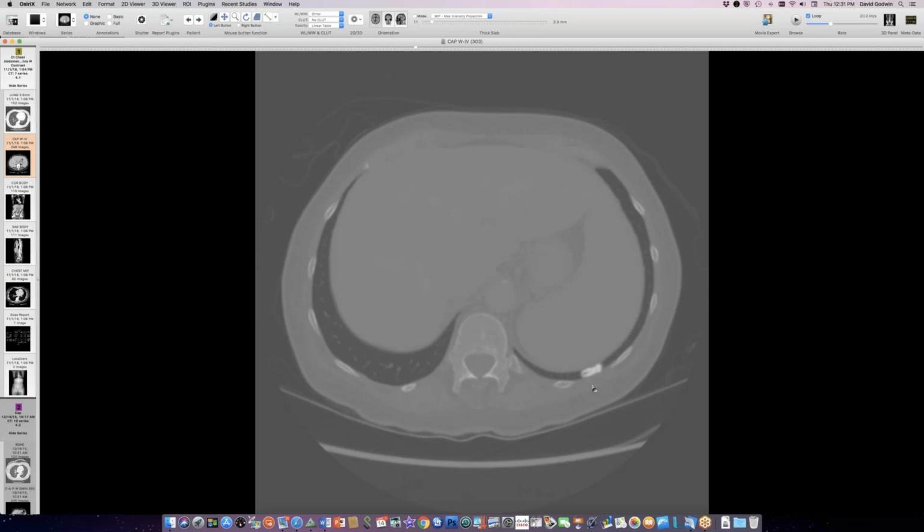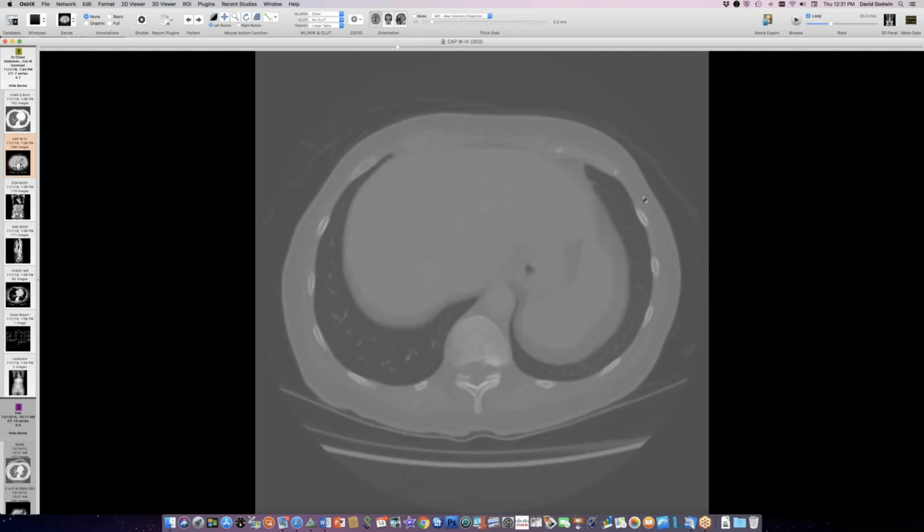That's very interesting. The thoracoliths I've seen before, if I remember, are always small, little round guys. Right, the same thing. So perhaps it's maybe cartilage or something like that, a tiny little dot of cartilage that got into the pleural space from an anterior rib or something like that, and then proceeded to grow. Doesn't it look as if it's derived from rib or cartilage?